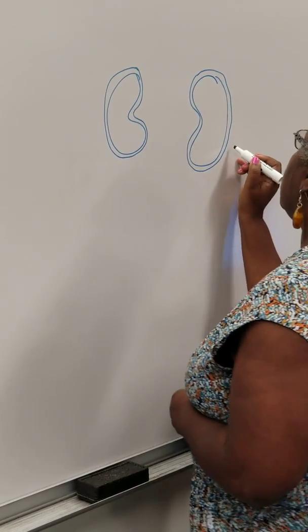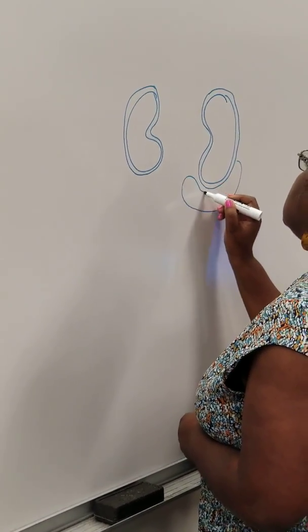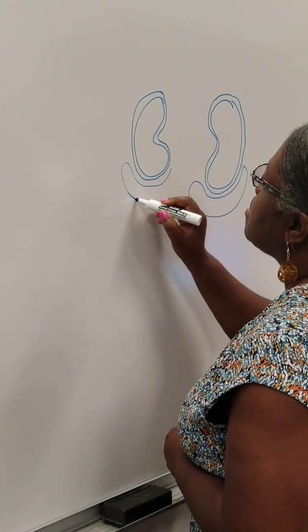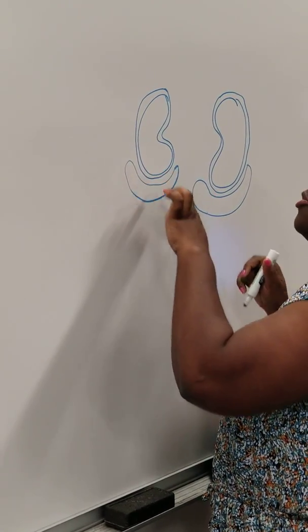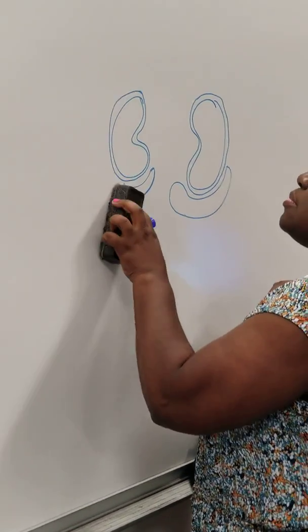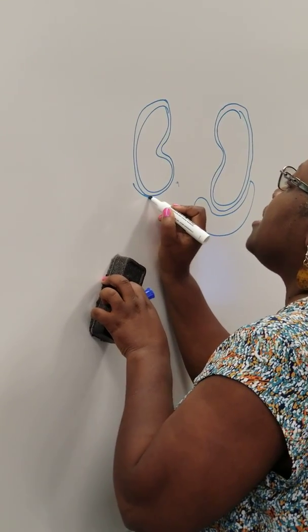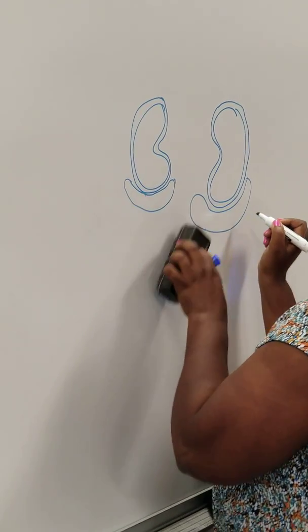And then when you draw your background, closer, move up, right here. So about as close as we can get, yeah, without touching. It's like a little moon.